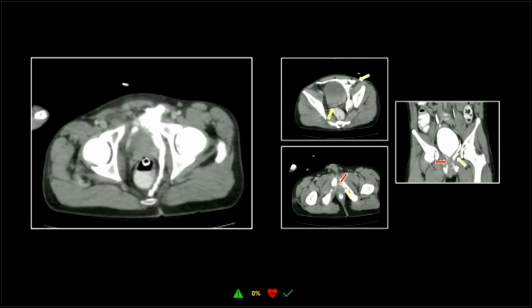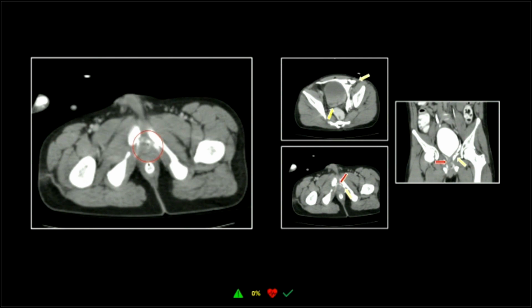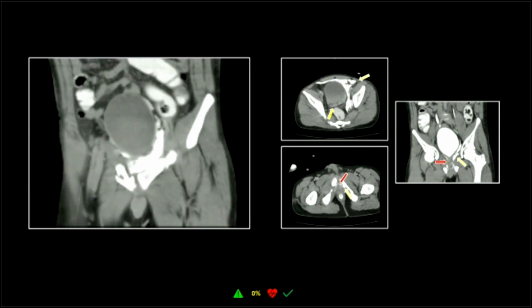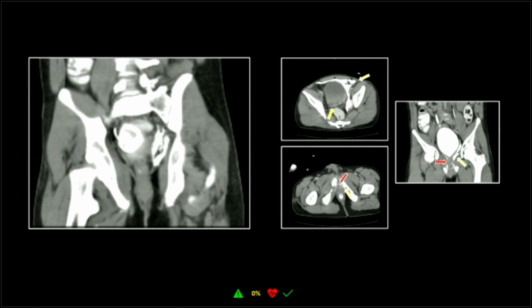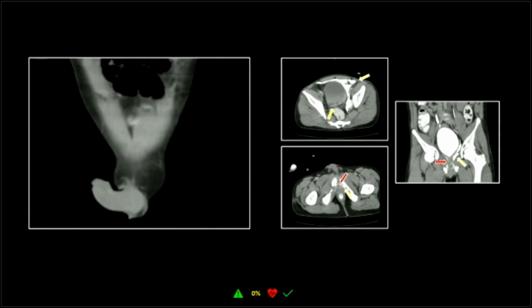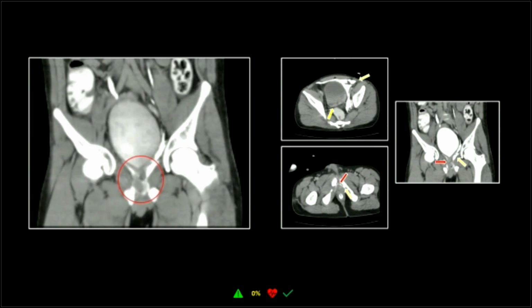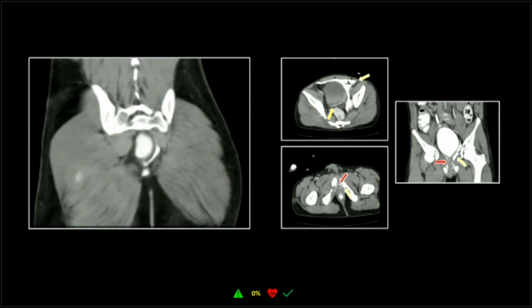And so there's the bladder clot. Now we're tracking the urethra there, and that's right where the contrast is spilling out of it, kind of left anterior aspect. And we'll look at that on the coronal as well. You can see there's a little buckle to the urethra. And you can see that bladder neck is not contiguous with the urethra. All right, that is a urethral laceration.